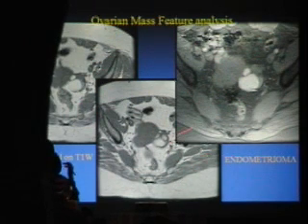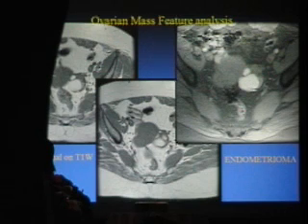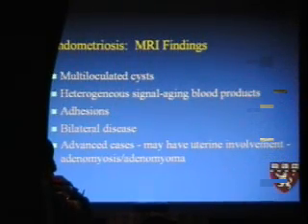It is an endometrioma. This is the classic appearance of endometriomas: multilocular, hemorrhagic, blood-filled chocolate cysts from pathology. Remember, that's the buzzword, the way they describe them. And the blood can be of different ages, because the menstrual cycles will cause bleeding in different parts of the lesion in different months or in different parts of the cycle. So it's heterogeneous, it's multilocular.